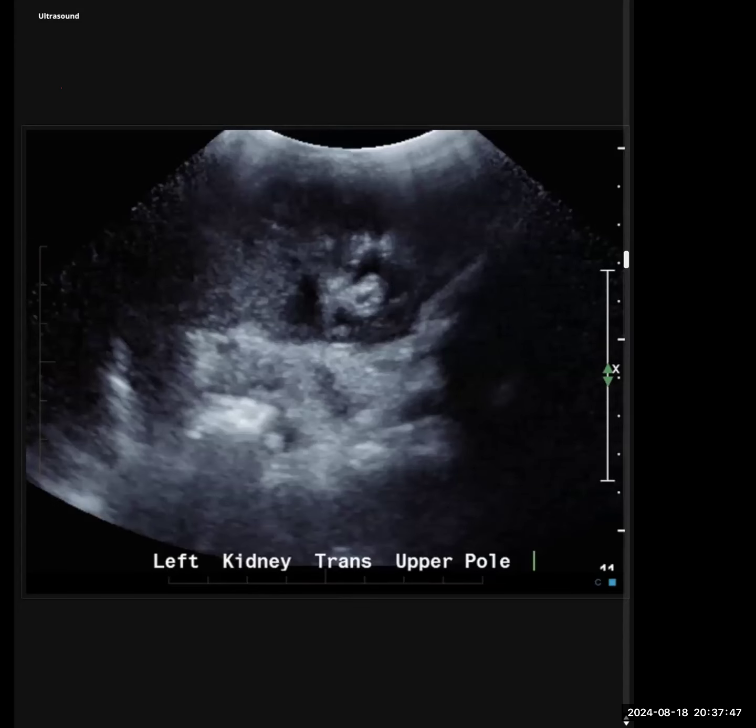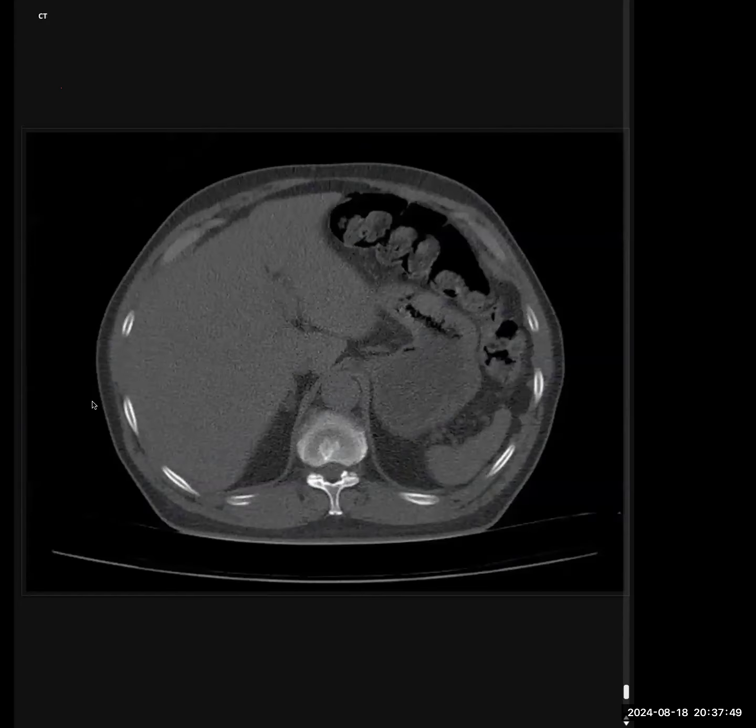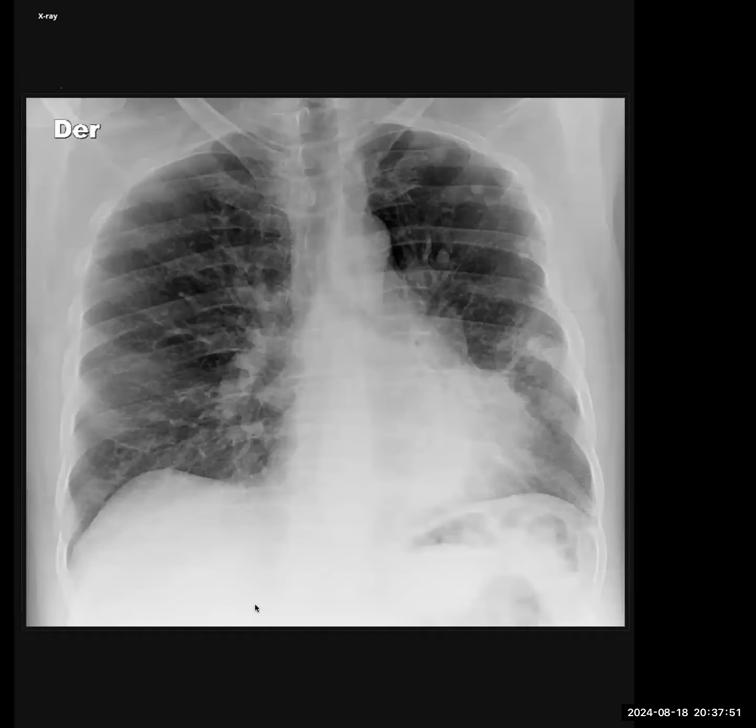Okay, cool. So this was case 1, and you focused a bit too much on what you thought were interstitial abnormalities. There probably are some, but they are not the major findings, as you know by now. This was the major finding, which was a retrocardiac opacity, which you confirmed on CT, along with multiple nodular lesions everywhere in the left side.